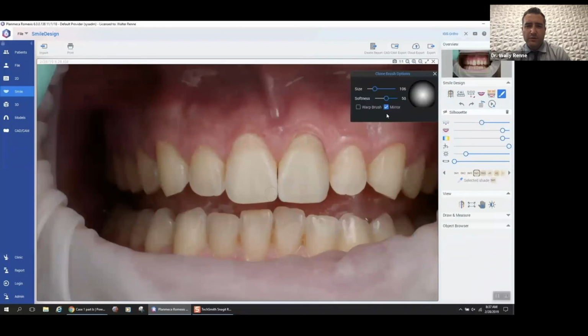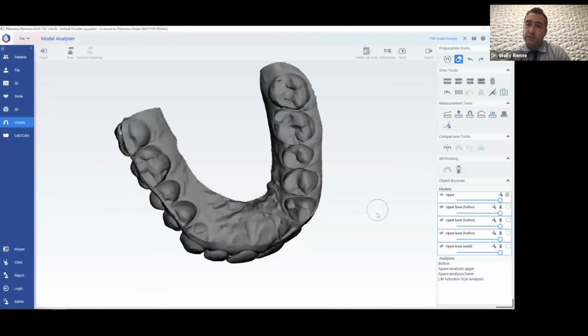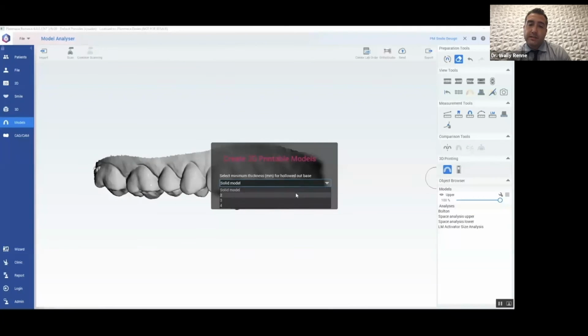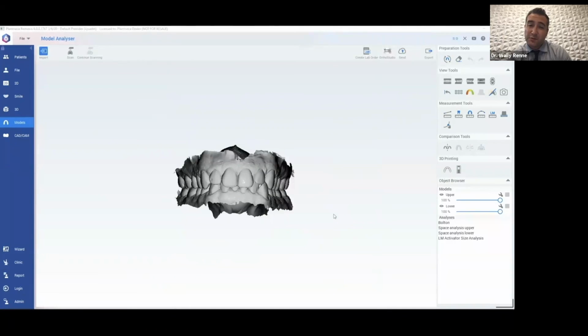They even have this Photoshop type module where you could mirror image teeth, sculpt teeth in 2-dimensional, and then transfer that in this instance to the 3D world. If those of you who are 3D printing, you could instantly hollow and base your models. That was pretty much real time, guys. There's nothing quite as fast as this.